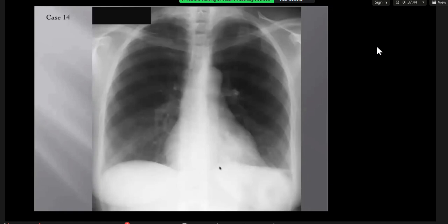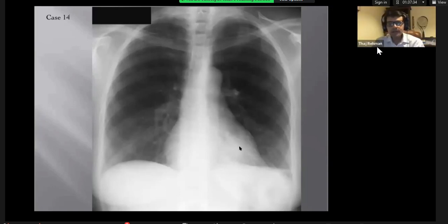Okay. So I'm systematically examining the film. The heart. I can see a retrocardiac opacity. Fantastic. Left retrocardiac opacity again. I'm hoping the rest of the candidates attending this session are able to identify that. It's quite behind the heart. You can see the lung there, a rib, where there is something sitting there. Usually you should expect the lower lobe pulmonary artery and the veins to be seen there, but you correctly identified the left retrocardiac opacity.